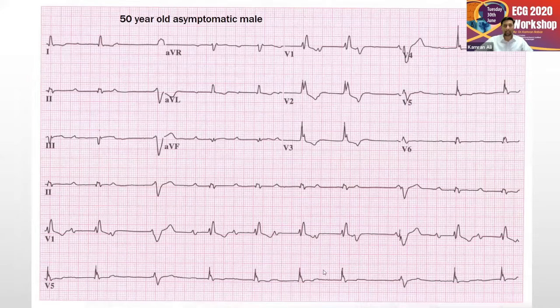So very similar ECG, right? What do you say? Our observation is, question number one, P wave. Do you see the P waves? There are these beats which have that alif madda or biphasic P. So there is an atrial enlargement. V1 has an RSR prime and it's wide, so it's a right bundle branch block. There is a downsloping of the ST. So this is not normally an ischemic change. These downslopings in V1, V2 denote normally a bundle branch block kind of finding.